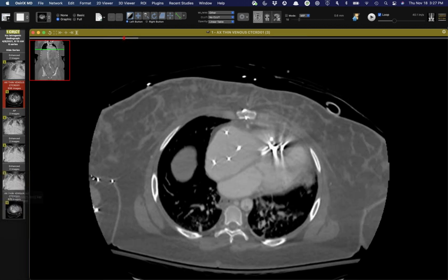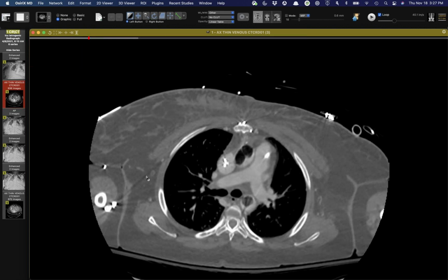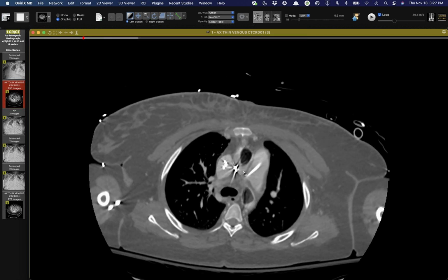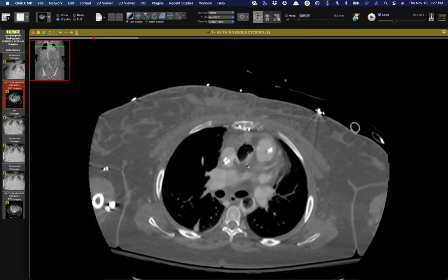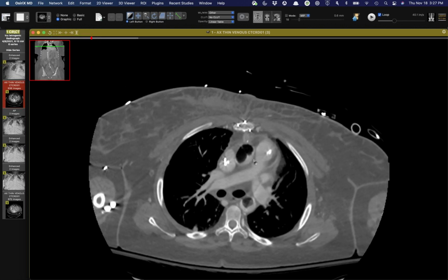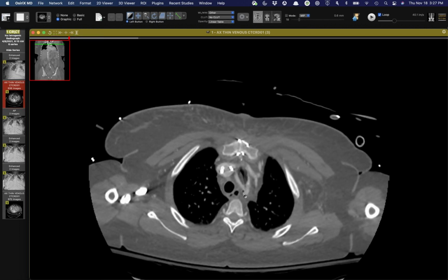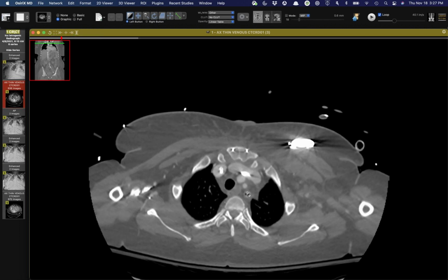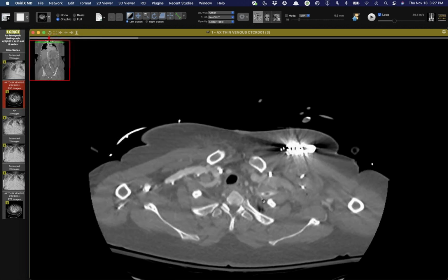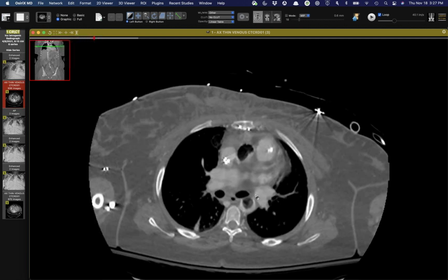single AP view. Do you mean that the balloon is, the sausage is kinked? Yeah. Holy cow. Right, because the balloon is starting here, going inferiorly into the ascending aorta, so coming proximally, and then loops back around right here, comes back up into the arch. Because you can see this is the portion of the catheter going into the left subclavian artery. Yeah, and then it comes down the aortic arch.